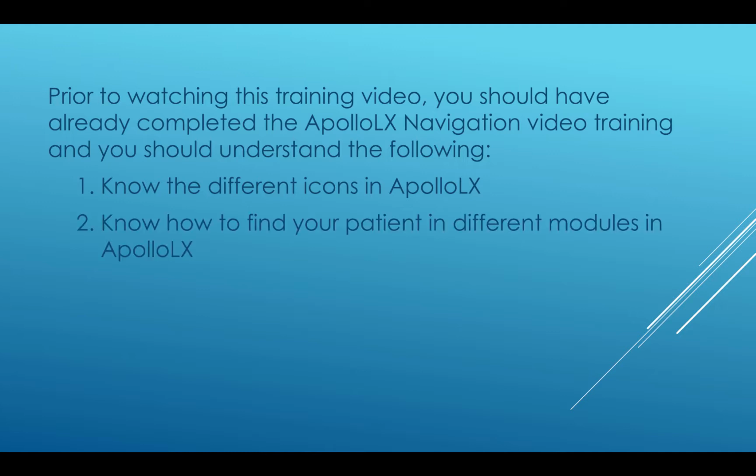2. Know how to find your patient in different modules in Apollo LX. 3. Know how to navigate through a workflow to edit or add data. The objectives of this training video are the following.